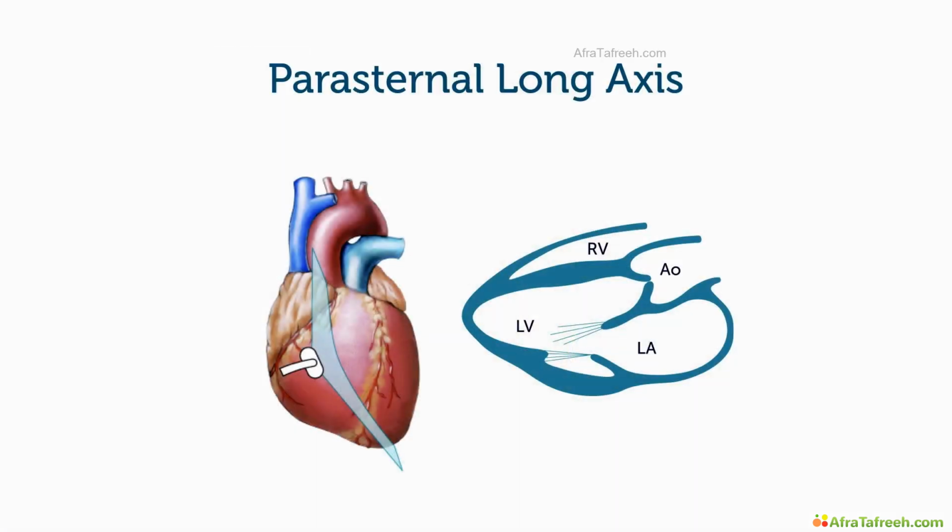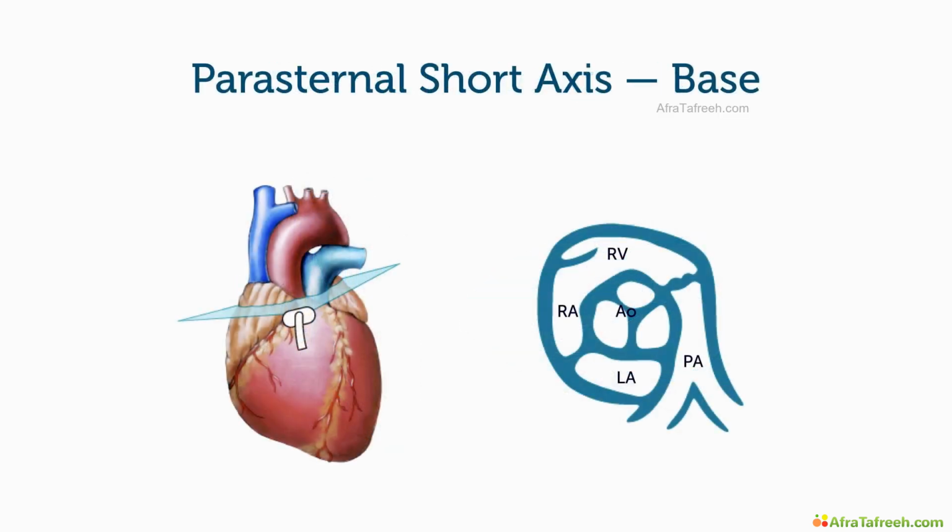in the last chapter. Yes, when we were talking about aortic valve stenosis, we were imaging the heart from a parasternal long axis view, which cuts the heart, now you know very well, somewhere here through the aortic valve. And we also used the parasternal short axis view at the base, where the aortic valve is always in the middle of our view. But now we want to see if you are ready to make your own diagnosis. So I propose we go through a test.